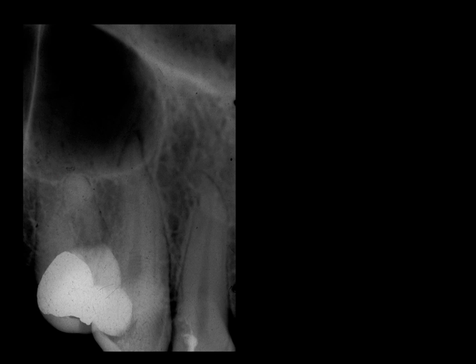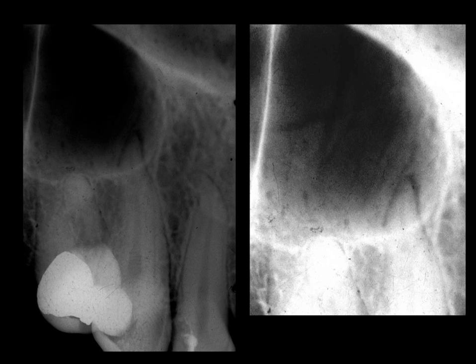Well, if you're ever presented with this problem, one approach is to turn up the brightness and the contrast on your radiograph, or if it's a film, to bright light it from behind. Now when we do this for the radiograph on the left, we can see on the right that there are numerous thin radiolucent lines traversing the area. These are neurovascular channels in the wall of the maxillary sinus, grooves in the bony wall.